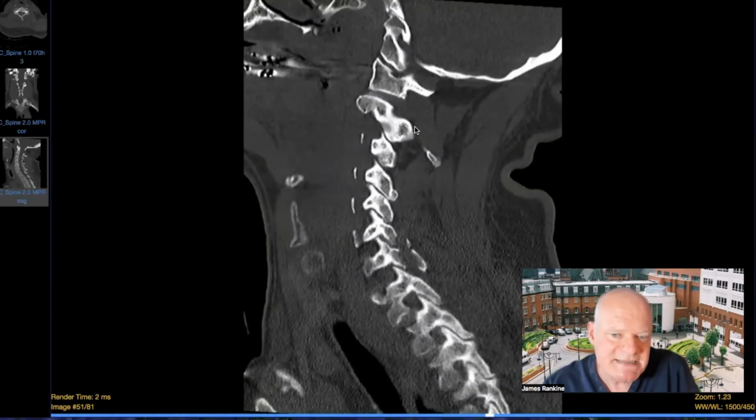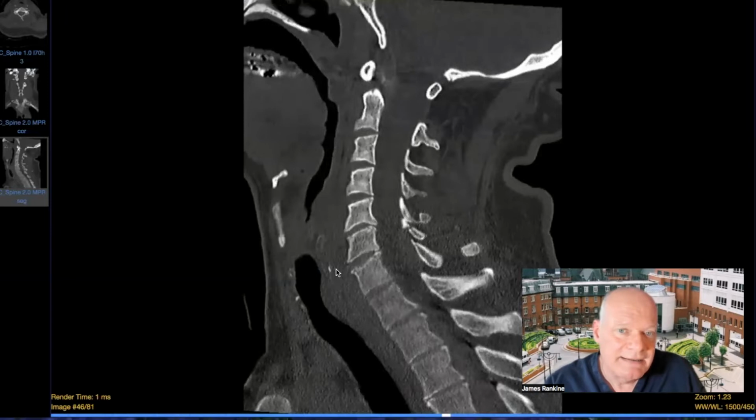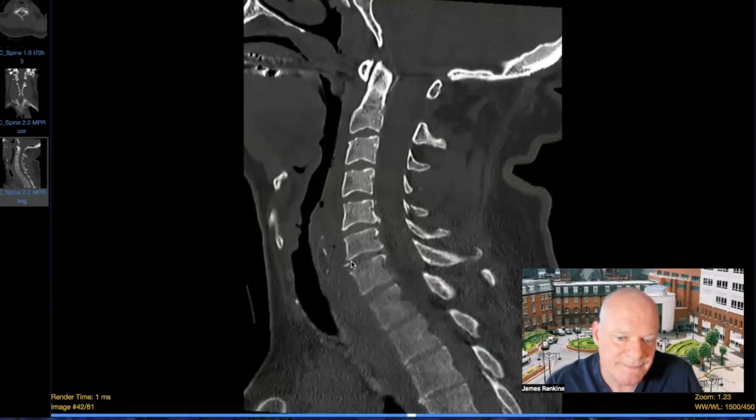So what this means is that there's been a force applied through the back of the spine. And in the cervical spine, this means that there's been hyperextension. So then we're looking for a distraction injury at the front of the spine. We're looking for linear flakes of bone that have come off, and here it is. Here's the linear avulsion here, just at this site here.